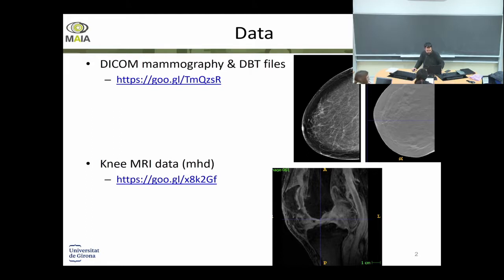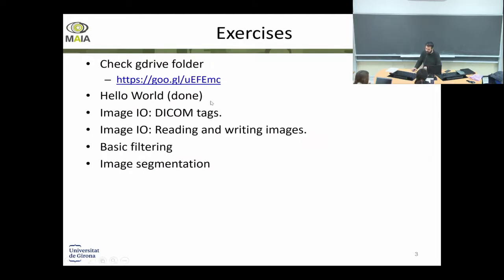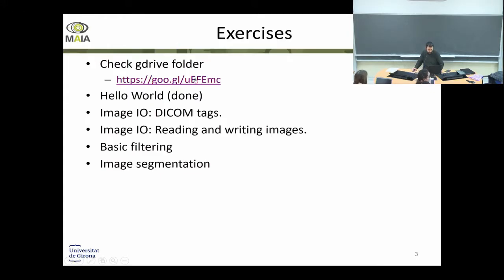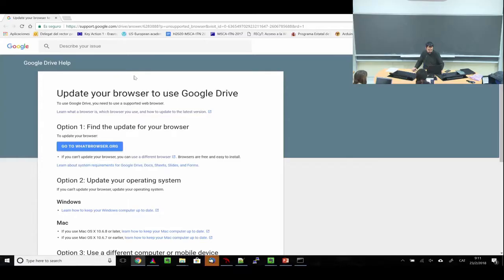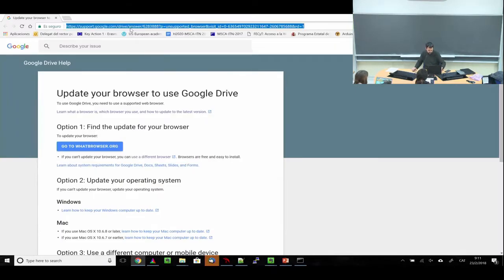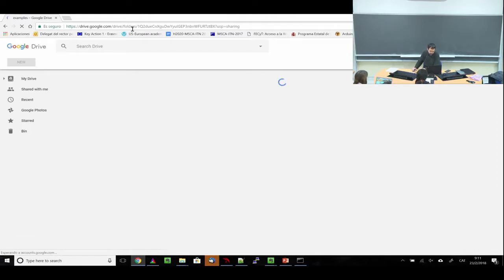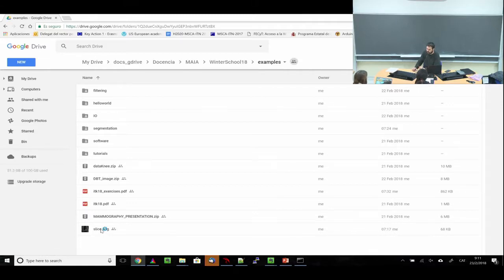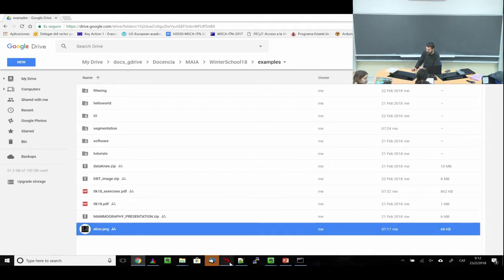I've included in the folder, you'll see one called slice PNG. I have added this as slice PNG.